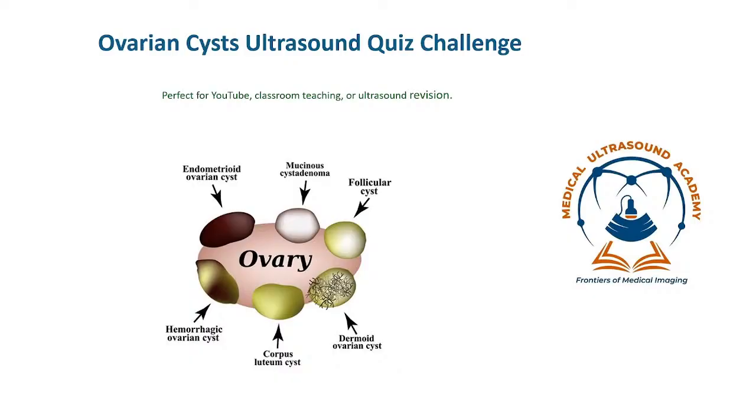Ovarian cyst ultrasound quiz challenge 2. Welcome everyone. Can you attempt these quiz sessions? This quiz session has a very rich combination of different ovarian pathologies, ovarian cysts. So you are going to master the different types of pathologies in this session.